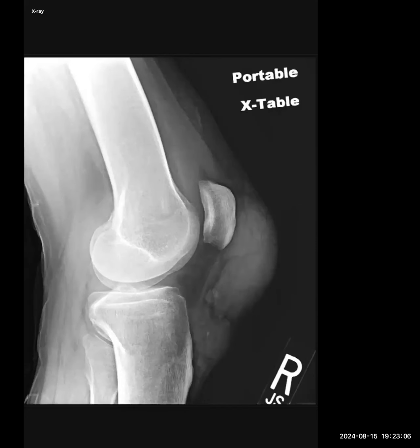Let's go. I'm presented with the lateral radiograph of a right knee joint. I can see there is soft tissue swelling anterior to the patella and also anterior to the tibia. There is a joint effusion in the suprapatellar fossa. Otherwise, I do not see any lytic or sclerotic lesions in the femur, tibia or fibula. I do not see any fractures.